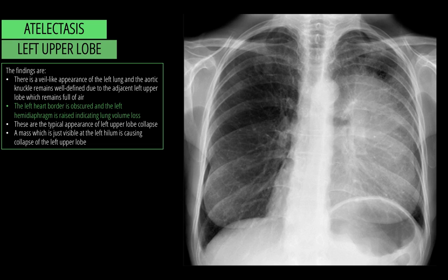If we then consider atelectasis of the left upper lobe, we can see firstly our airways are still pristine. So we have trachea in the midline, carina, right and left main bronchus. If we consider our diaphragm, the shape looks pristine on the right, and we can trace most of our pulmonary vasculature to the periphery. Notice this is a female patient too, so you can actually see the shadowing or the skin folds associated with the breasts.